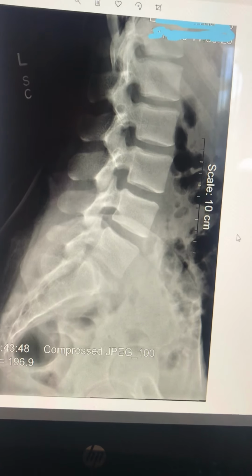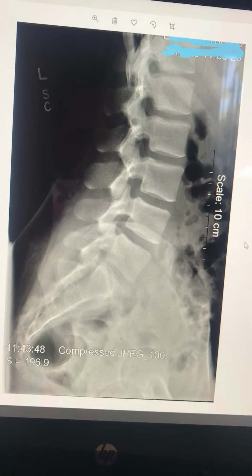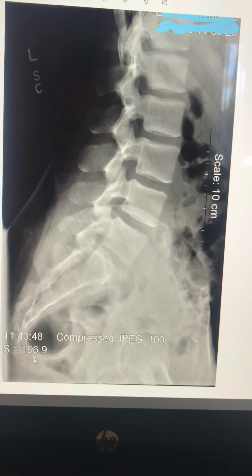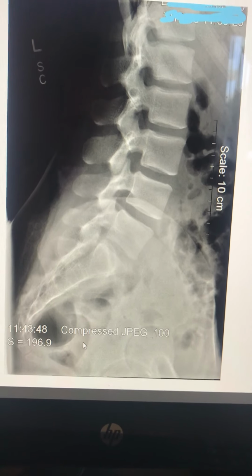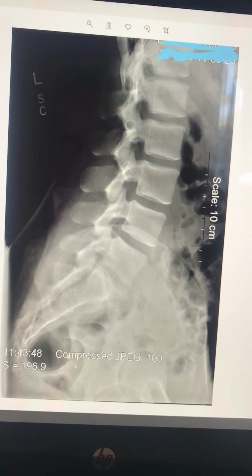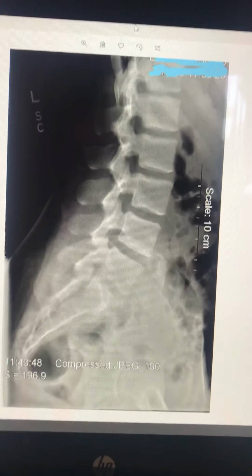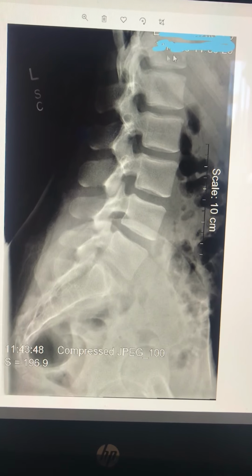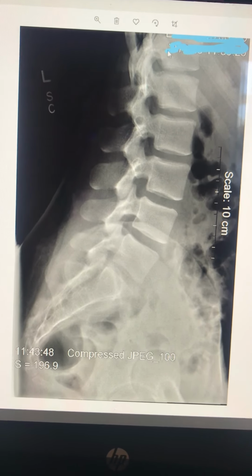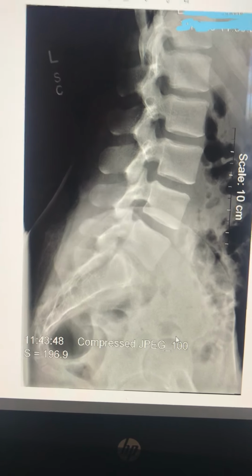It's centered. Collimation was left open, which included the sacrum and the coccyx down here. I believe the collimation could have been reduced from the top to the bottom just to clean up the image a little bit. We didn't need all of this. Maybe just a little bit less of the top. 1, 2, 3, 4, 5. Maybe just less of the bottom.